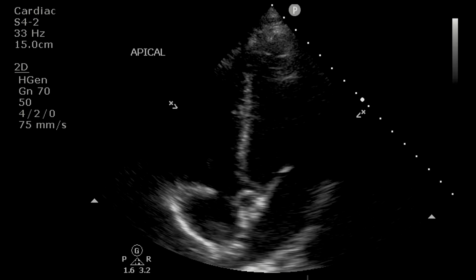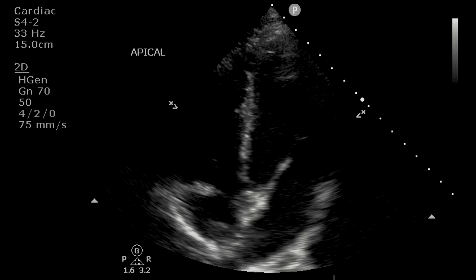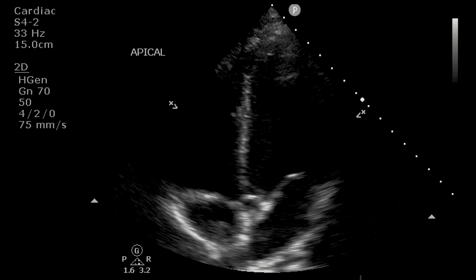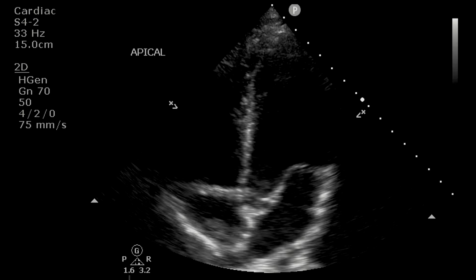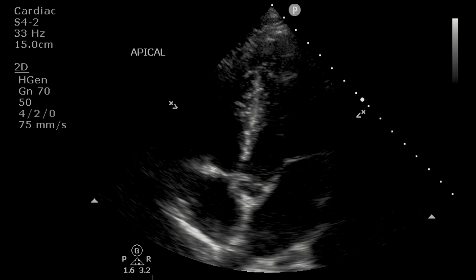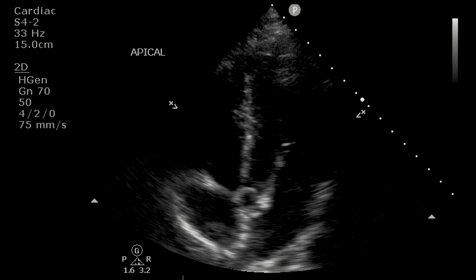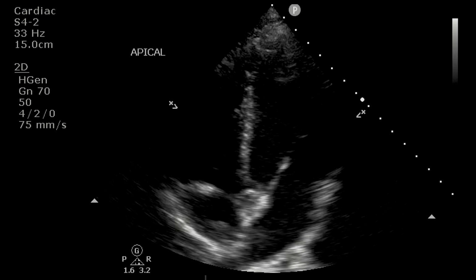But if you have an incomplete window where the lung is curtaining over top of a portion of that ventricle and you cannot see that ventricle, you do not have a sufficient view of that left ventricle to be able to say definitively that this is what you're looking at. And so really, to be most accurate, you have to have an assessment of the entirety of that left ventricle in the window that you're looking at, or supplement it with other windows to fill in the pieces where the image is lacking, essentially, right? So that's technical pitfall number two.